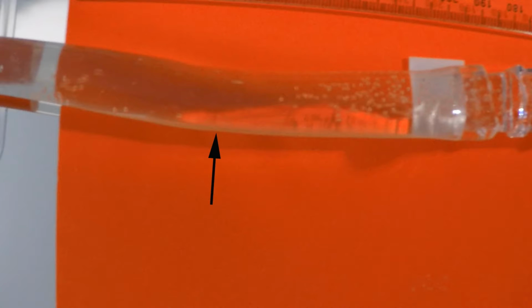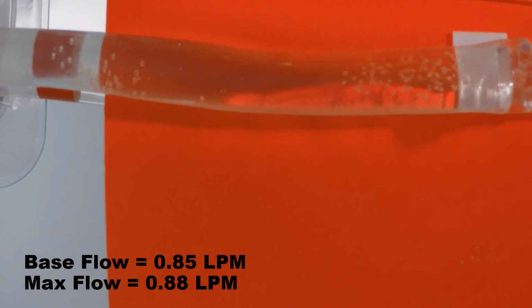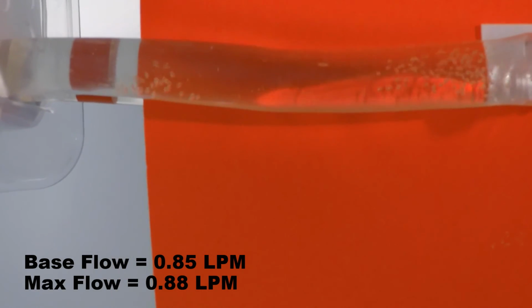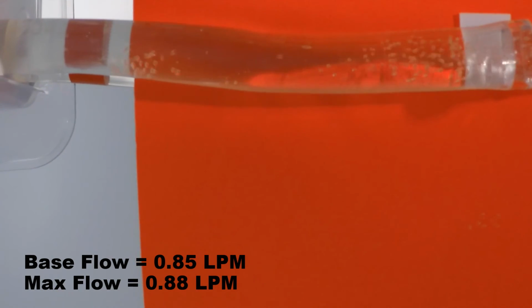Here we see two clusters of small bubbles circulating at low flow on opposite sides of a bend in the tubing and tubing connector. Observe the area indicated by the arrow to see how increasing flow rates affect buoyancy. Notice how the higher flow causes individual bubbles from each cluster to move back and forth between them as they are carried in what appears to be separate countercurrents.